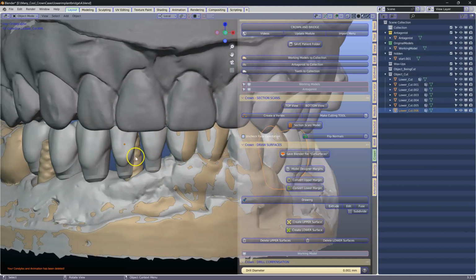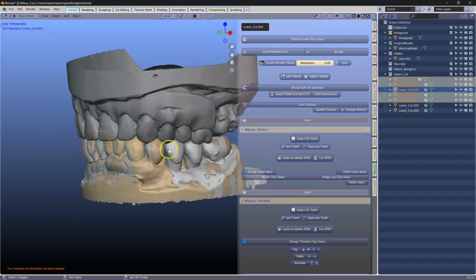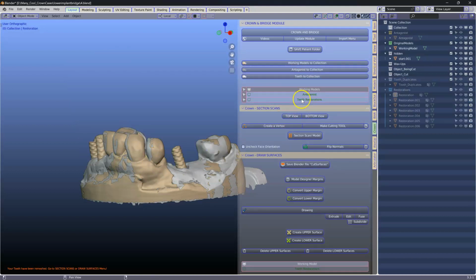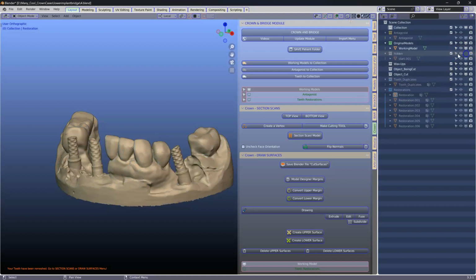The necks of them, okay, that seems okay. I think I will manipulate the mesh on the gum a little bit as well, but first of all we're going to put them into the collection, into this collection teeth, which will then remesh these as well. So it's hidden away here, so you can always access it later down the line. The hidden can remain hidden for now.